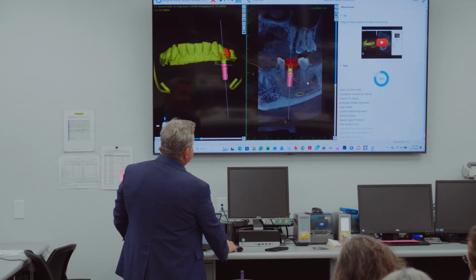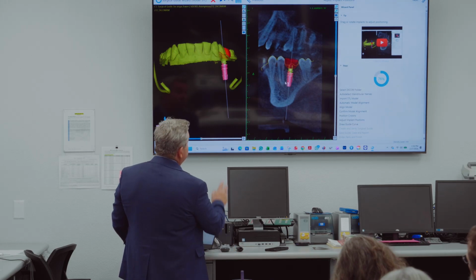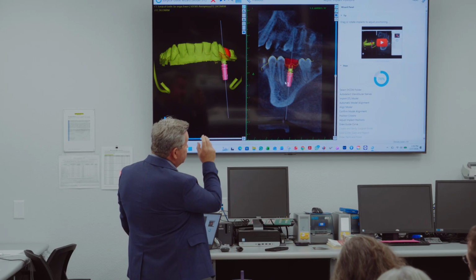Say you don't like the height. Is there anything about this placement we don't like? Even if there isn't, let's make something up, okay? Because I want to change it. So you can change two things. And this does not have the occlusion.